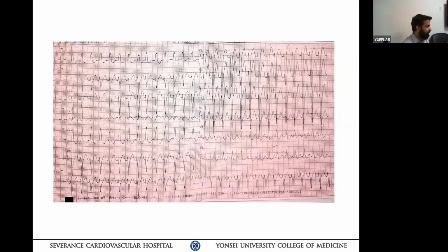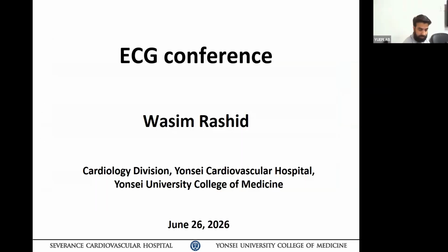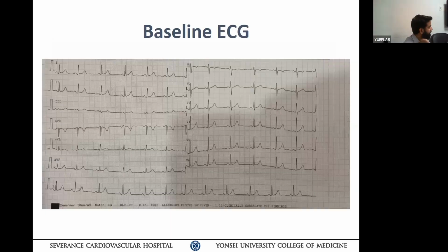Okay, let's vote. There's one group which favors that it's a typical LBBB and SVT with aberrancy, and the other group favors VT. Okay, let's vote. SVT. 3, 4. Oh, you changed. I'm VT. Okay, 3 people. 4 to 3.